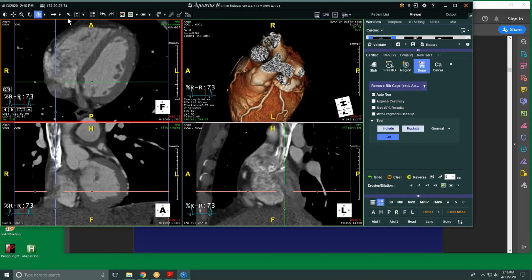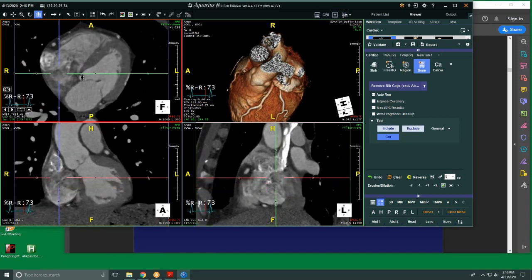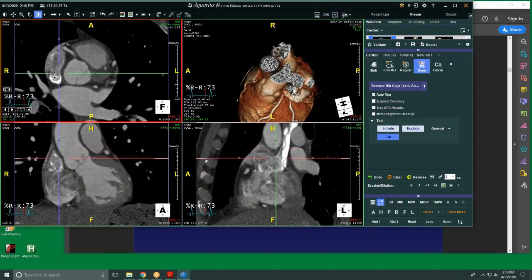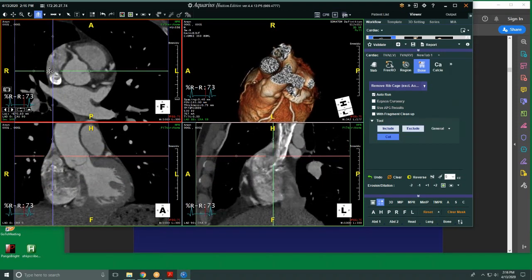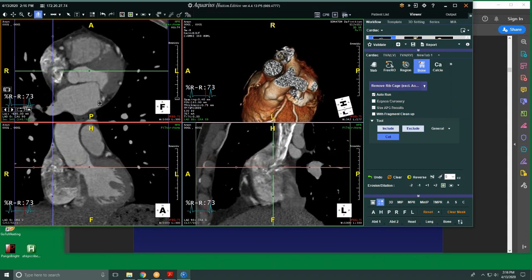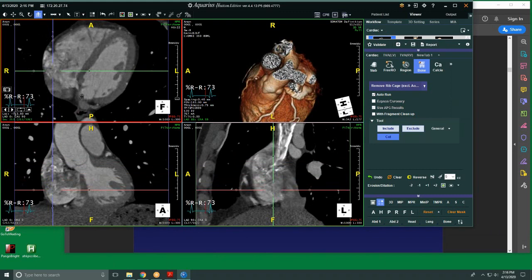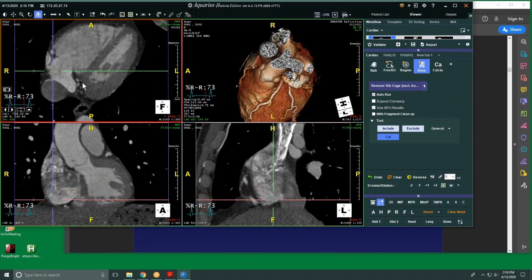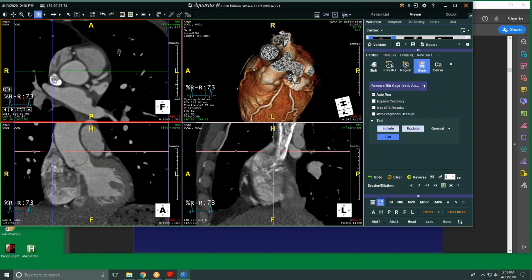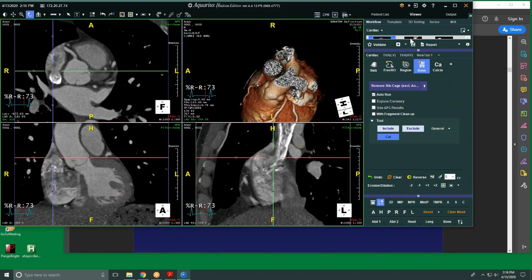The crista terminalis. So in the superior wall of the right atrium, see right there? Where is it? Right there. See that? That has formed a little fibro-fatty ridge right over there that can every once in a while pooch out into the lumen of the right atrium a little bit and can look a little nodular and can be a little bigger in some patients. It's called the crista terminalis, and that's a normal structure.